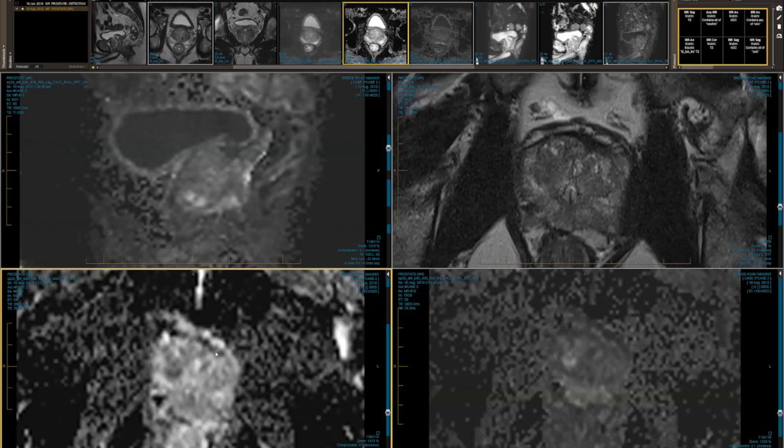Whereas I think with small lesions, sometimes you can be absolutely certain they're tumour. And I would call those a 5, even though they're not 15 millimeters and they don't show any invasion, because I want to convey that if they come back negative at biopsy, and we haven't discussed this, the biopsy needs to show something that's giving the MR signal.